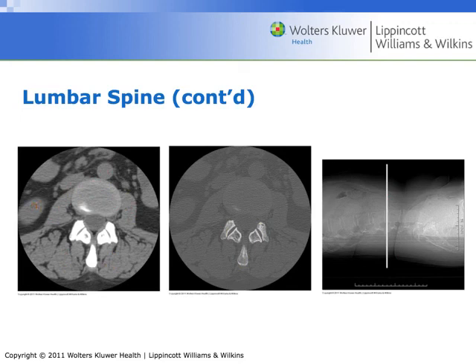South pole of the right kidney. It's still difficult to see, or no, we can see it better right here. The ligamentum flavum, dural sac of the spinal cord, and right over here, and right over here, that's the quadratus lumborum muscle. Alright, thank you. Hopefully this was helpful.